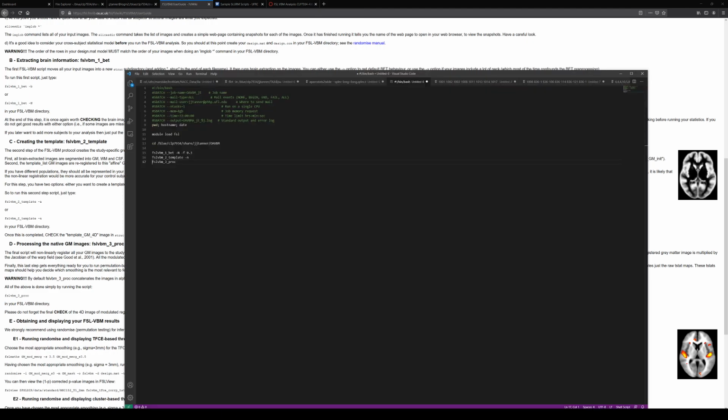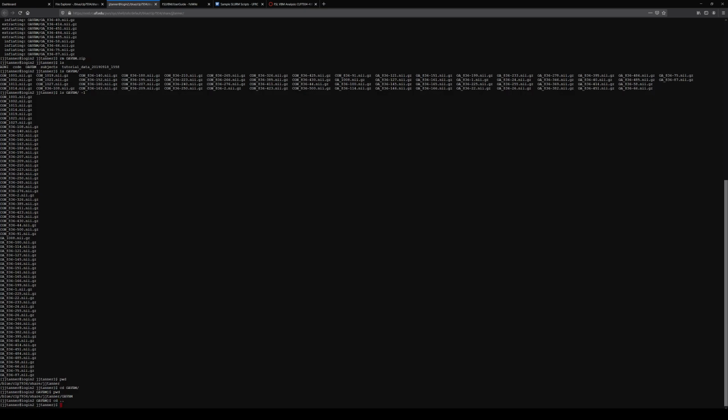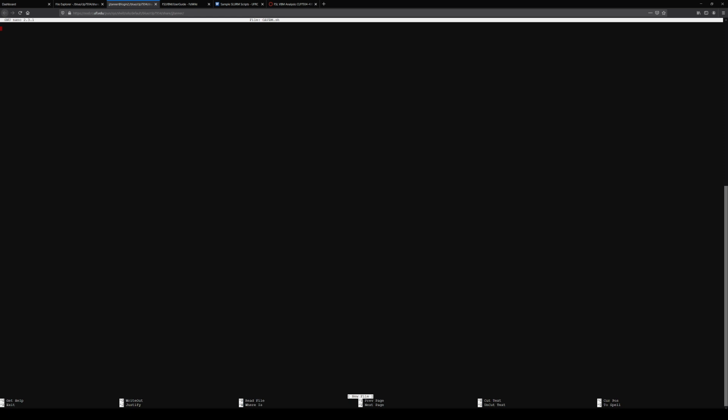So that's what we're putting in our script. And that's all the script is really going to be. And then I'm just going to put date at the end so we know when it is done. Now I can save this and upload it, or I can just copy this and then come into either this directory. I'm actually going to go up a directory, and I have a code folder, so I'm going to go into my code folder, and then I'm going to do nano, and this is going to be my OA VBM, and then I will paste this in.